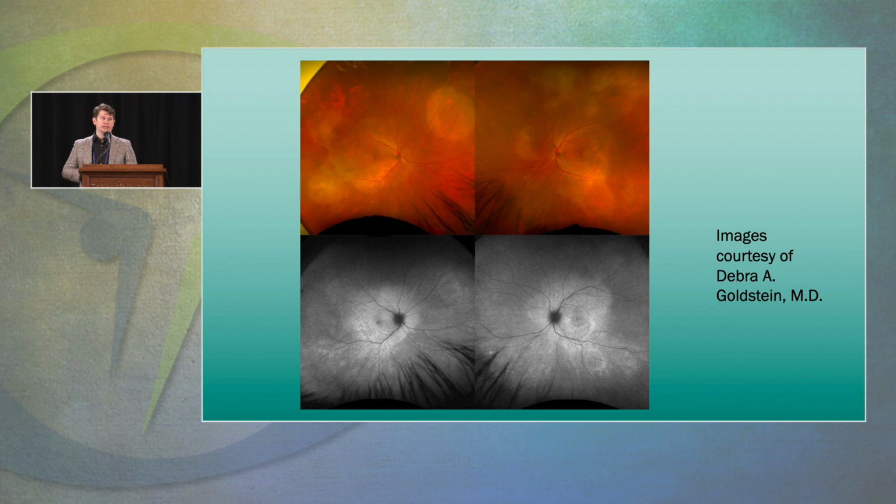It is not nearly as prominent on physical exam when you look for this. In fact, you can completely miss it on physical exam if you're looking with just a 90. And then you can see actually on this case, there's also involvement throughout the entire posterior pole in both eyes, but I just think that superonasal area pops up and is very prominent.